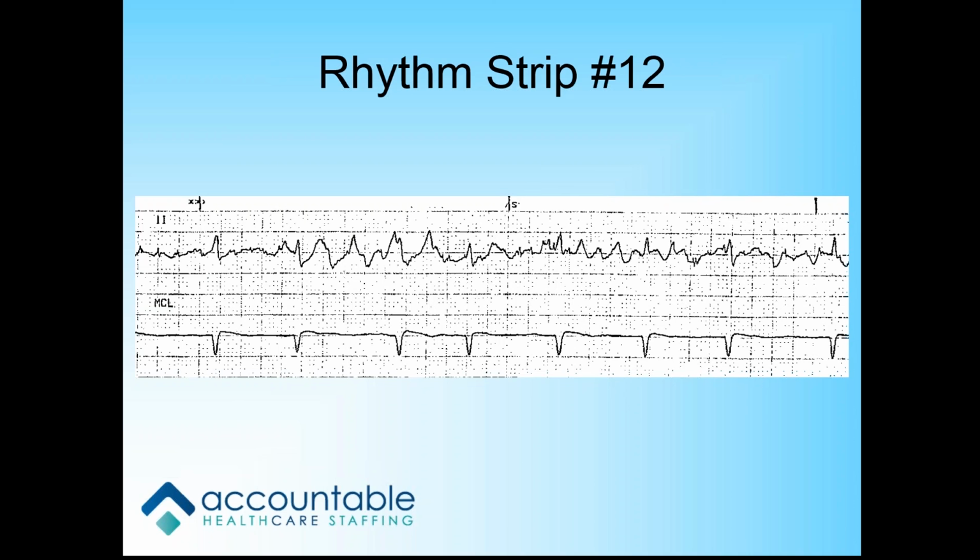Irregular, a little bit. It's irregular. Yeah, it is irregular. Very good. Do I have P's in here? Not in that lead, no. That's why you need to fix that top lead, right? So you can see the P's fibrillating.